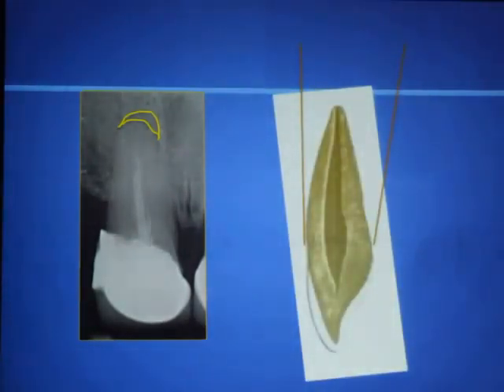If we get a different view, is that the bone loss around the tooth? Is that the size of the bone loss that has created that small radiolucent image? Or is it that small where they have less marrow bone and more cortical bone involved? Or is it much more marrow bone? You can draw another 1,000 different combinations here, and we wouldn't know what is the exact bone loss in this situation here.